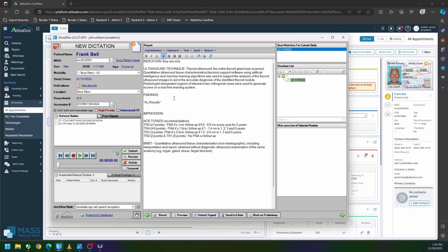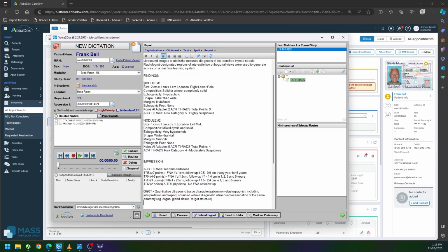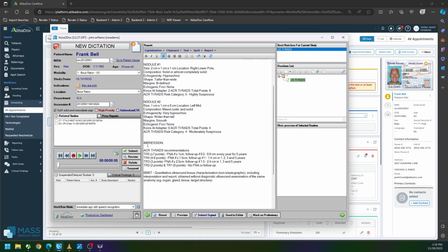As you know, the American College of Radiology Thyroid Imaging Reporting and Data System, TI-RADS, provides management guidelines for nodules that are discovered incidentally on ultrasound, including a standardized risk stratification system based on the TI-RADS lexicon to inform practitioners about which nodules warrant biopsy.